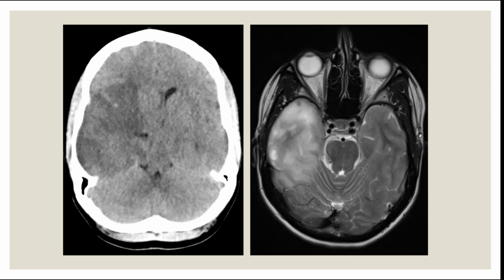So this is a tumor. You can see it is edematous. Comparing the left side and the right side of the brain on the MRI image, you can see that the left side is more edematous. You can say it's a tumor. That's enough. If you're able to tell exactly what it is because of the location, it's an intraaxial tumor. You can say this is diffuse astrocytoma. But you will still learn this, inshallah, next week in Radiology Seminar.